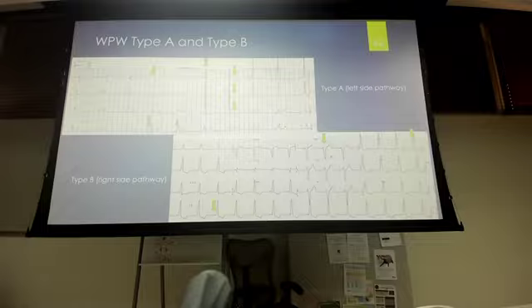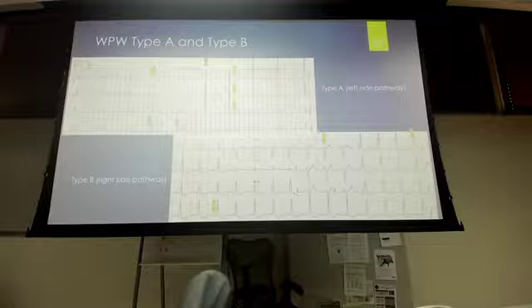That's normal, right? We would expect a very small R wave here. The R wave here gets bigger, and then we have a larger R wave here with hardly any S wave. So we expect that. We have a normal R wave progression, but what we have here is T wave inversion.